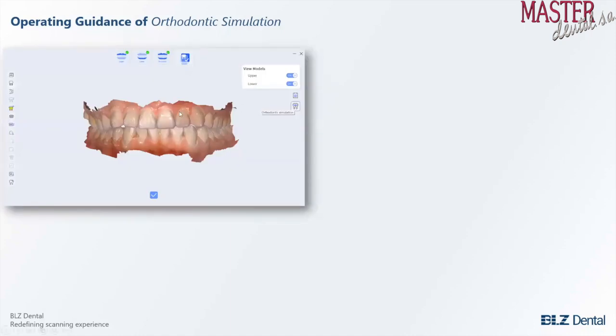first, what we need to do with orthodontic simulation is follow the workflow of the orthodontic cases scanning. And when you finish, at the finish page, you will find the orthodontic simulation function button at the right side.